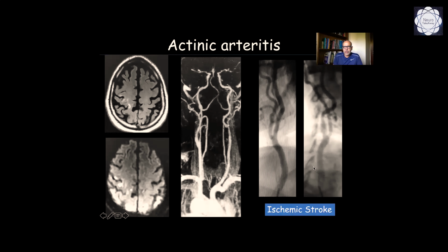I want to highlight the importance of this finding and the difficulties that we have with their treatment, because they are not amenable to endovascular treatment, because the walls of the arteries are fragile, so they have to be treated with caution with surgery.